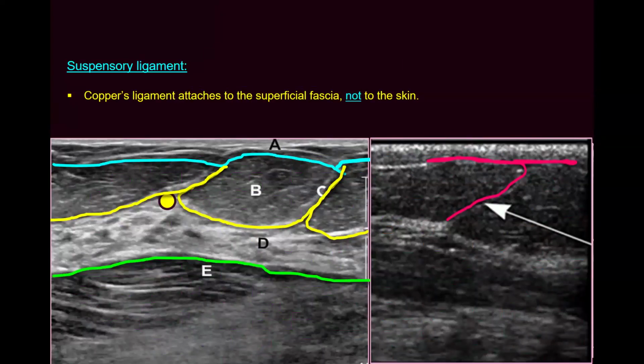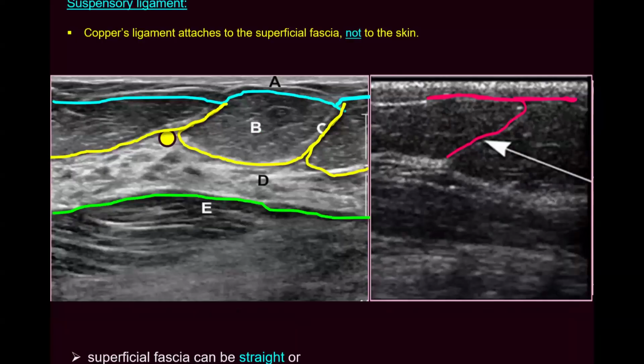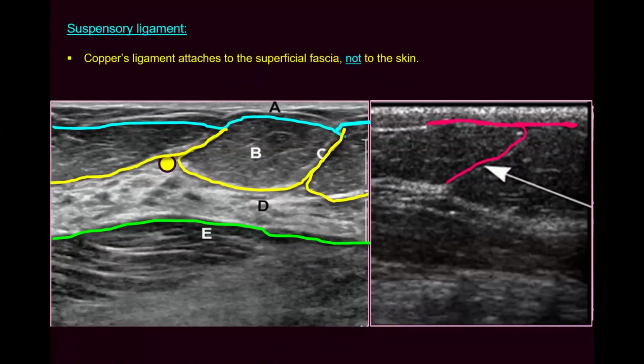Okay, so Cooper ligaments, as we mentioned, are attached to the superficial fascia, not to the skin.